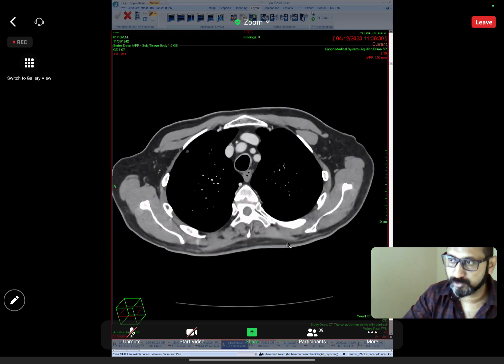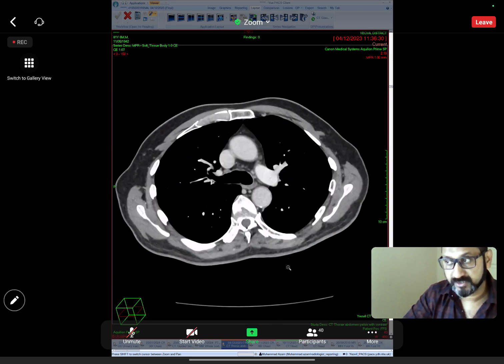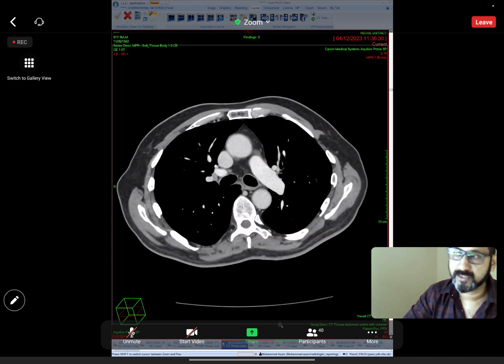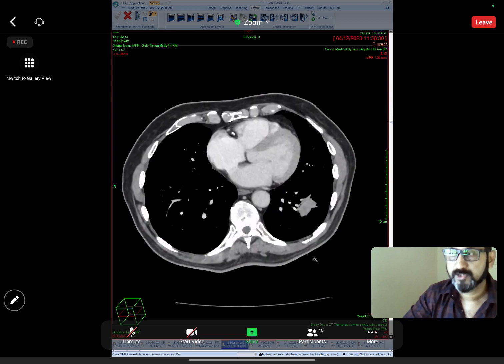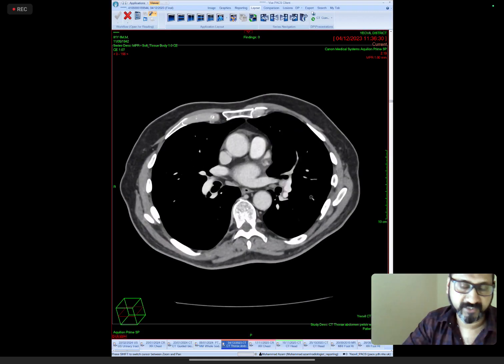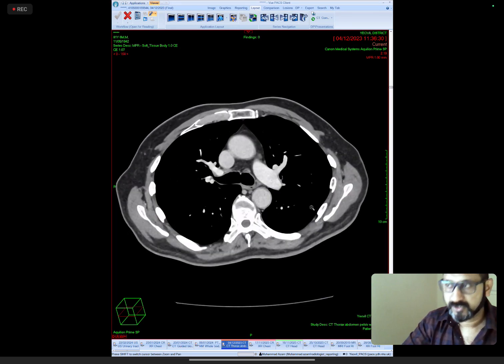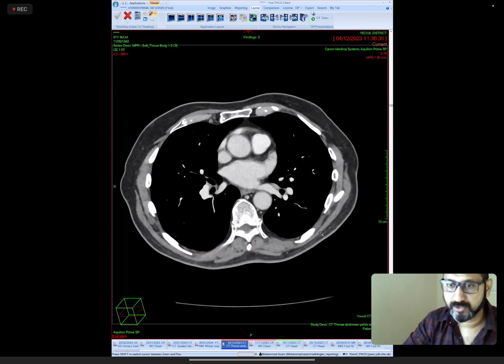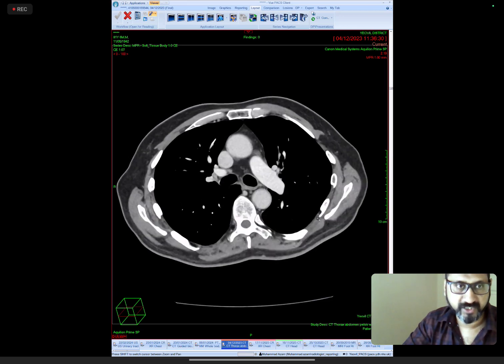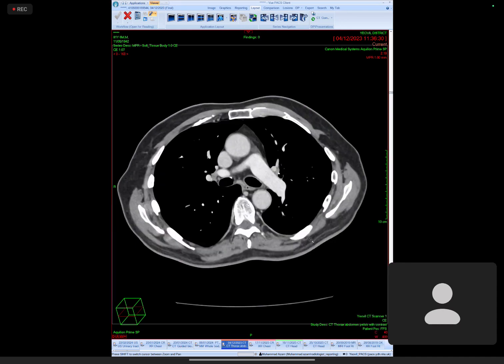If you would have seen some lymph nodes here and there, you could say that you could see lymph nodes less than a centimeter, which in this neoplastic case, you are unable to figure out. It is indeterminate lymphadenopathy, so I would request a PET CT scan to see the activity. In this particular case, the PET CT scan was done and these lymph nodes were low activity, so considered as benign.